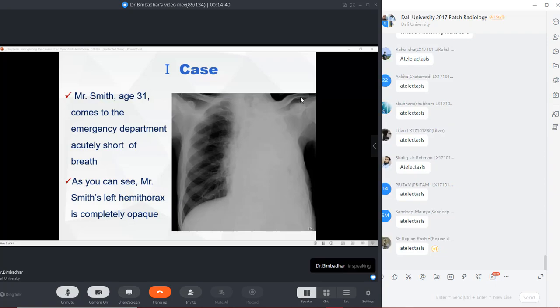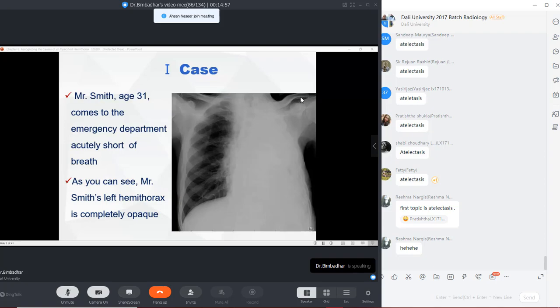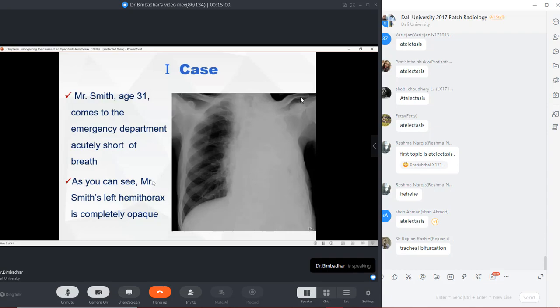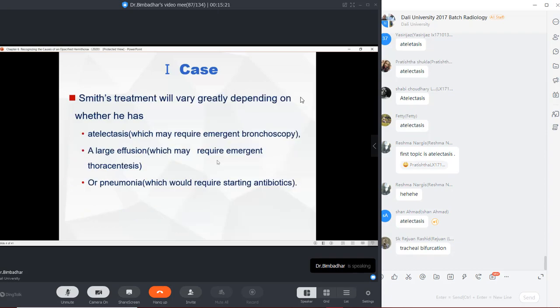Atelectasis, right? Okay. Now, I guess maybe you have been reading the slides, so that's a good answer. It is atelectasis. But how did I know that this is atelectasis? So there are some ways to find out. First topic is atelectasis, so that's the reason you are saying atelectasis, huh? Okay, don't worry about that. How can a radiologist actually know that this person has atelectasis or pleural effusion, or pneumonia of the entire lung, or pneumonectomy? There are certain hints for a radiologist to find out on a radiograph and differentiate between these four opacities.